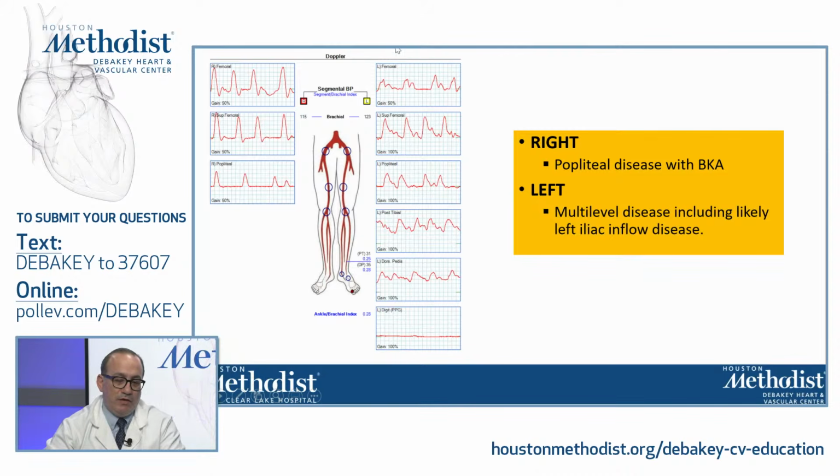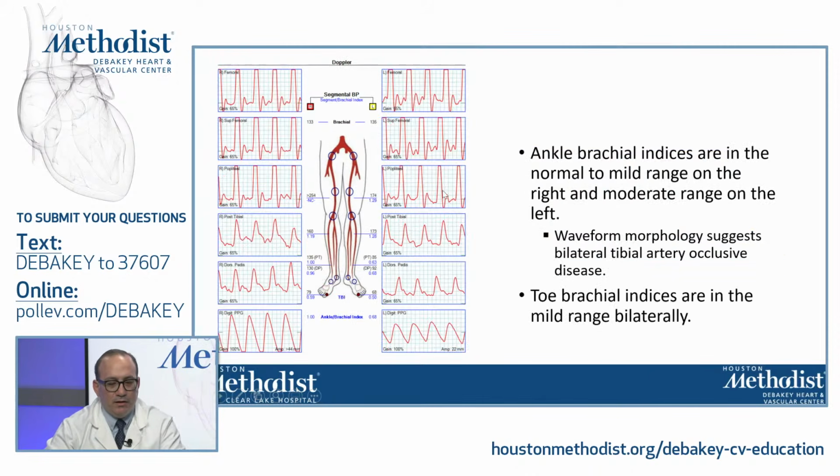So here we know that there is proximal inflow disease, and as the waveforms change slightly in appearance and become less symmetric in the tibial vessels when we compare them with the more proximal vessels, there's also evidence of tibial artery disease. Let's keep going.